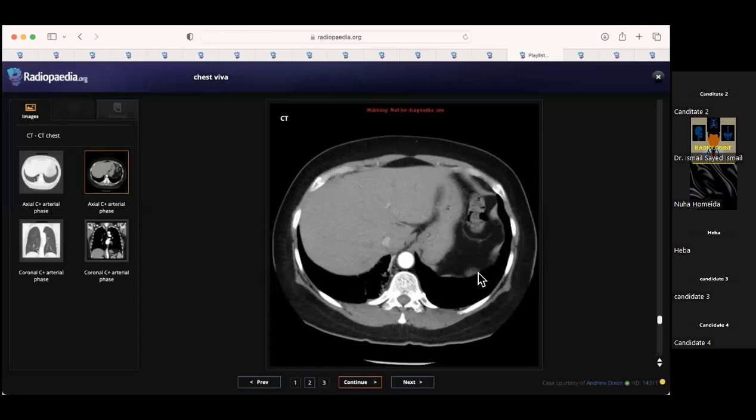This blood supply is suggestive of sequestration in the right lung, which is predisposing for multiple abscesses in this patient. Yes, so it is pulmonary sequestration. Whenever you're given a history of a young patient with a history that is a bit odd, with recurrent infection, recurrent lung abscesses, always be suspicious of pulmonary sequestration.